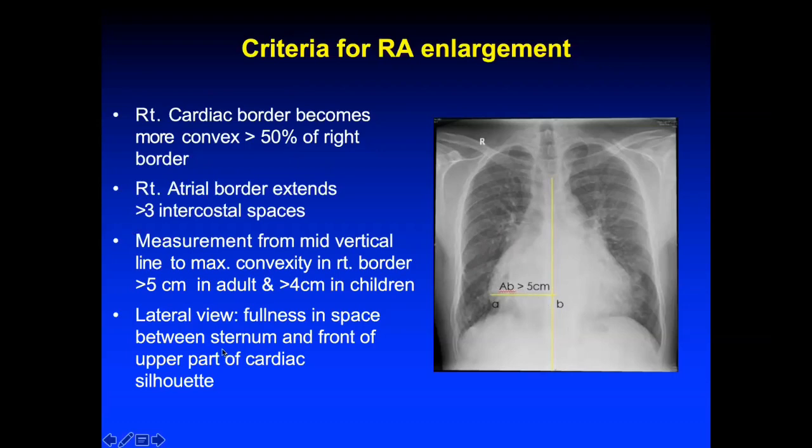On a lateral view, fullness in the space between the sternum and the upper part of the cardiac silhouette is again a criteria for the lateral view. Some examiners might ask you this.